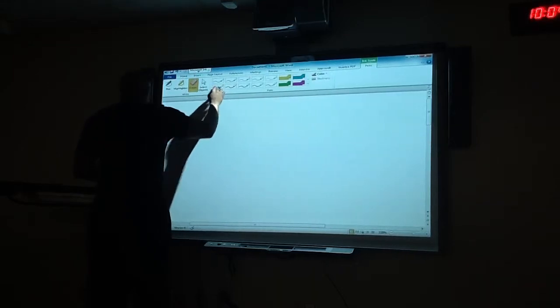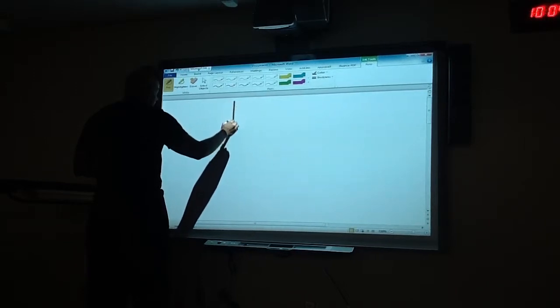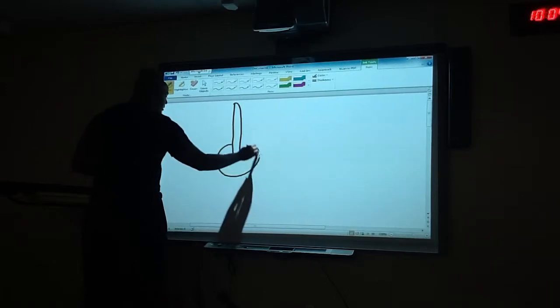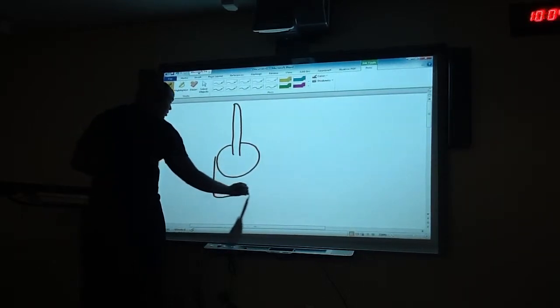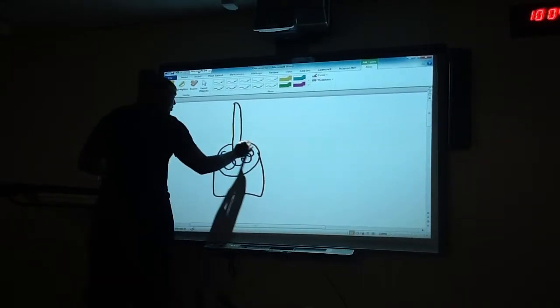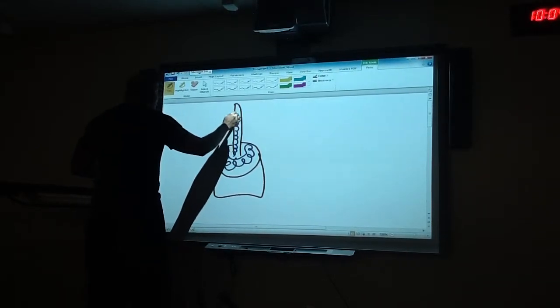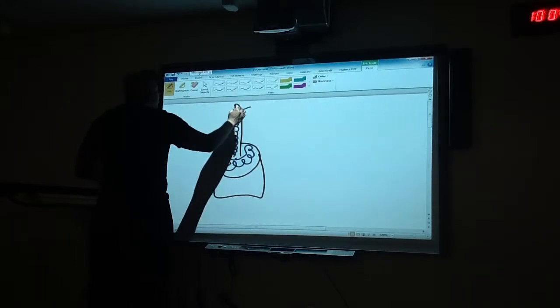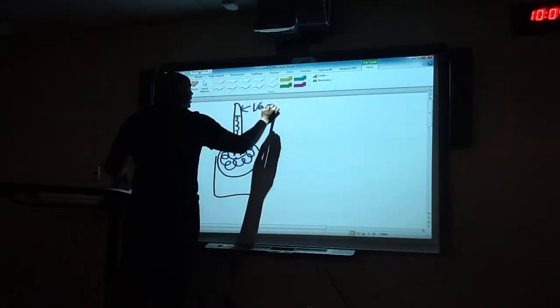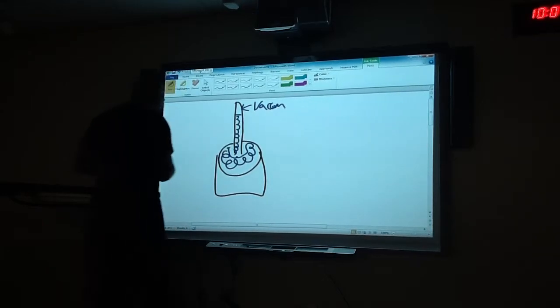So next, what I would do is just demonstrate how the mercury column works. So it's basically a tube, and it is filled with mercury, and it's turned upside down. Surface line. So at the top up here you have a vacuum. It creates a vacuum from it being turned upside down, kind of similar to you taking a straw and filling it with fluid and you put your finger over the top.